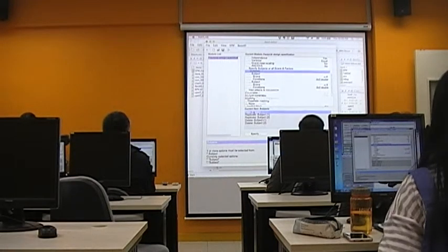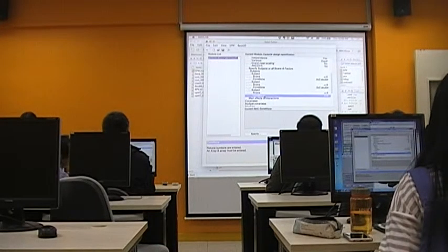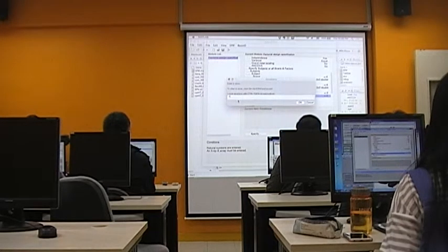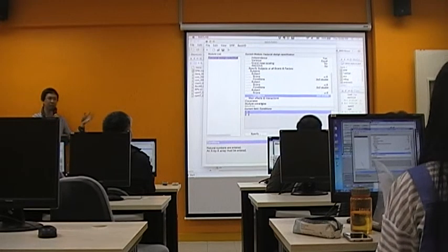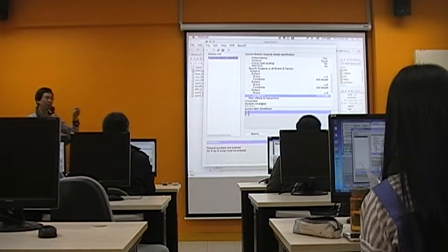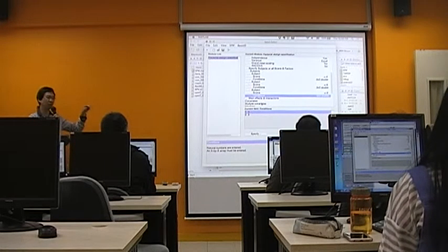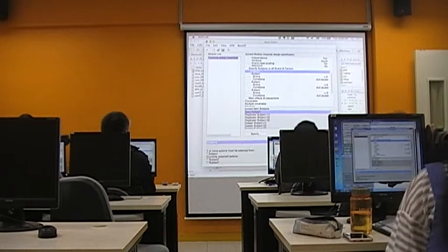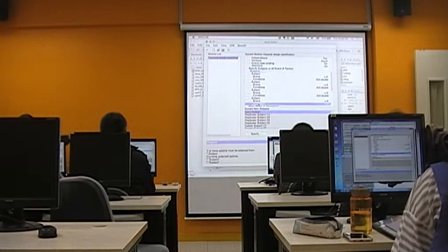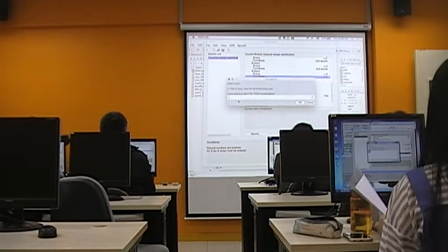Okay. Now, again, I assume that I put the scans for the one back and the two back images, and then I will say 1, 3, 2, 3. Because the first hypothetical scan we are putting in is the one back condition for the third subject, and the second image would be the two back condition of the third subject. And so on. Clear? I just want to demonstrate how you could define this. Let's say, okay, 1, 4, 2, 4.